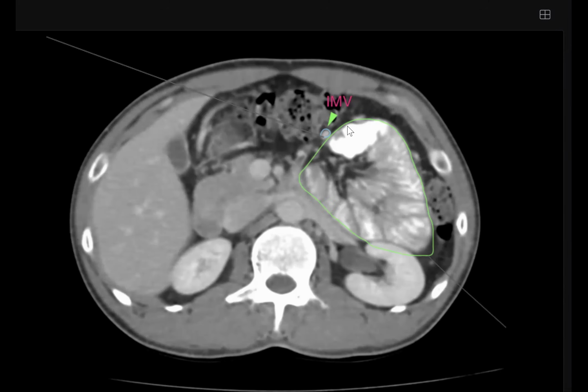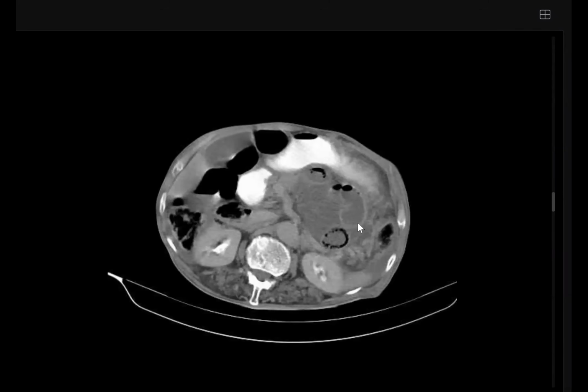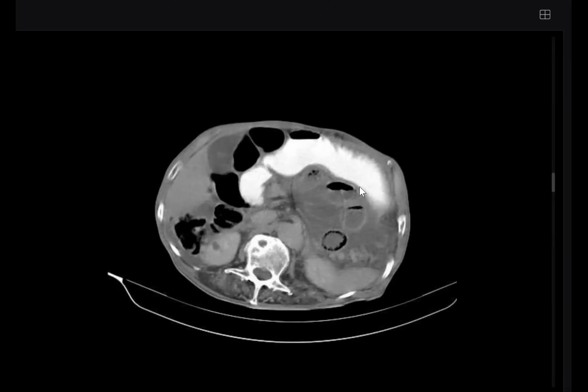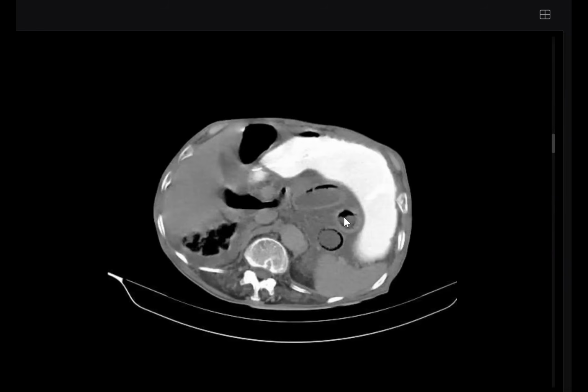It is contained within a sac. Okay? If the right-sided or left-sided hernia is contained within a sac, then it's paraduodenal hernia, in addition, of course, to the vessels. But I'm relying on the sac. In the previous case, you see here, I can see the lobulated outline of the bowel loop. It's separable. So it is not contained within a sac. The paraduodenal hernia should be contained within a sac, but this type of hernia is not. So this one is not paraduodenal hernia.